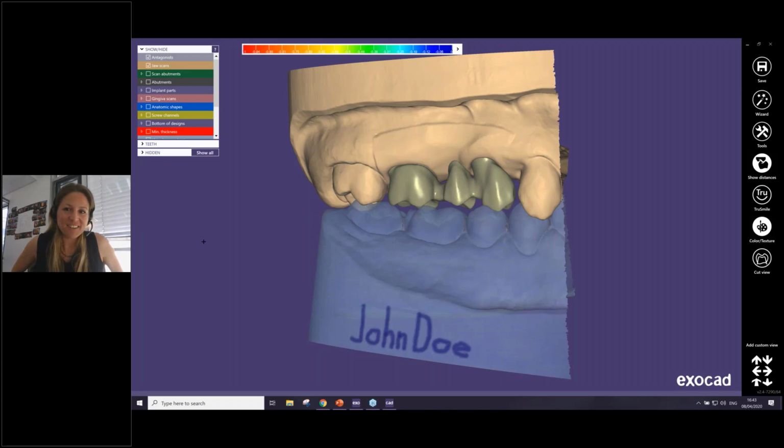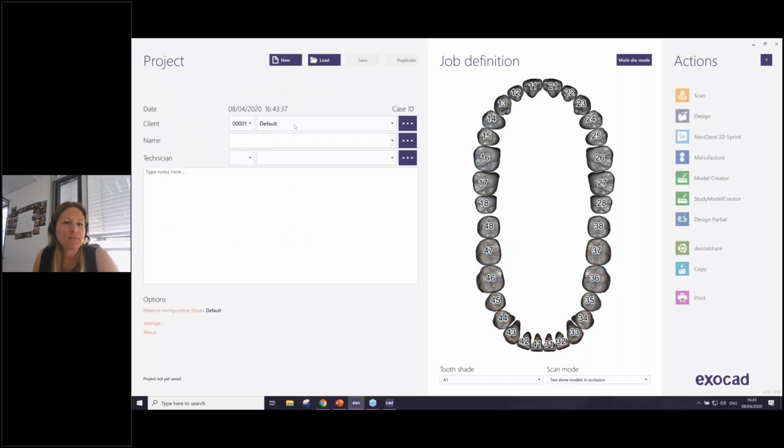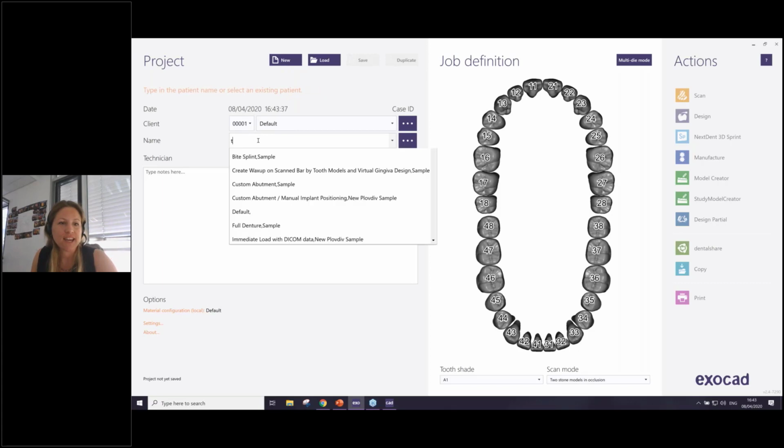This isn't completely pertinent to the webinar, but a couple of people asked if they change settings in DB, does that stay that way for all cases, or is that just for that one case that we're designing? Okay, yeah, if I have my client, for an example, or I choose a new one, okay? So I have my default client and test.